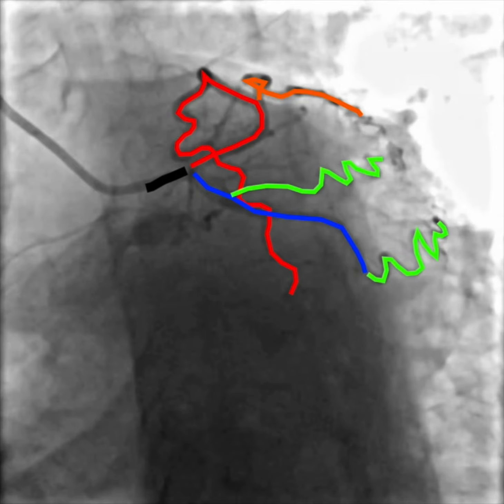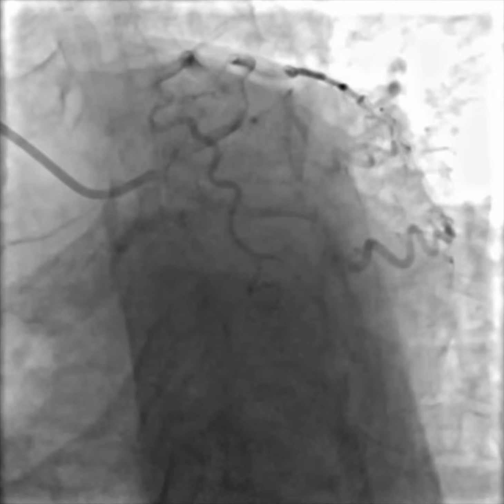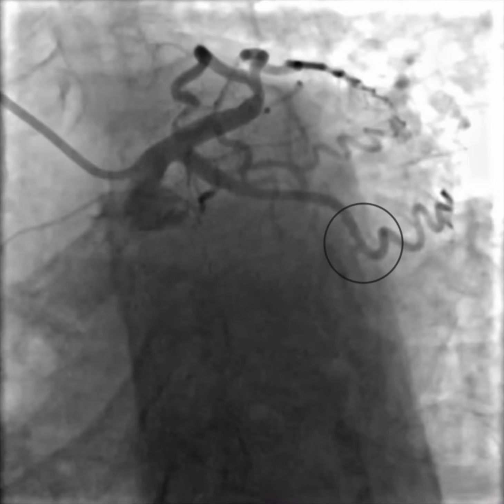And on the first playthrough, you really don't see that much, or at least I didn't. You may notice there's a lesion here in the LAD, but nothing really jumps out as sufficient to satisfy the case as we understand it so far. But I'll let it play through again, and instead this time I'll freeze it on the most suggestive frame that I was really able to find.